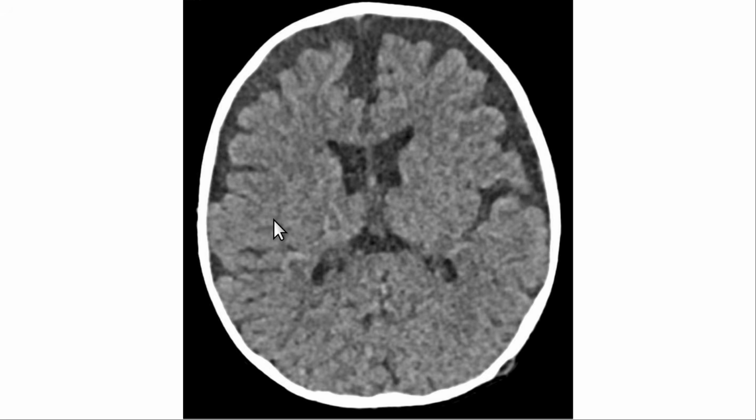So basically, 99% of the time, the horse is out of the barn, okay? The patient's already gorked. Their brain is severely dysfunctional, and it's kind of late to do just about anything, okay? And what I'm trying to say is, we see macroscopic things on CT. We're much better at seeing things on MRI, but still, even with MRI, this is usually all I see. Just an atrophic, shrunken brain due to chronic loss of cells, like from apoptosis, okay?